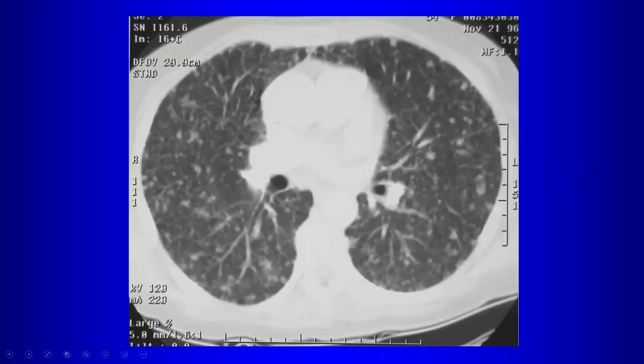Well, here's a CT on this particular case, and you all should be familiar now with how we approach the micronodular pattern on CT. How do we approach that? Well, there are the distributions, right? The three distributions that we have to know are random, perilymphatic, and centrilobular, right? So now how do we tell them apart? First you ask yourself a question, and the question you ask is?